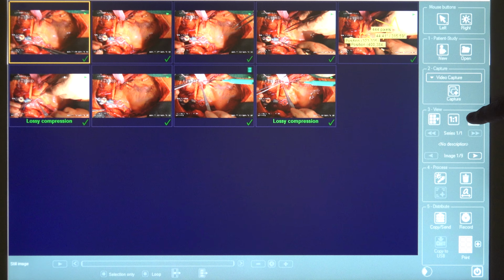After selecting a patient profile, you'll have the choice to either record images from a camera to the monitor or upload images or video directly to the VersaPaxx. Images and video may also be shared to the program over a network with a USB or DVD.